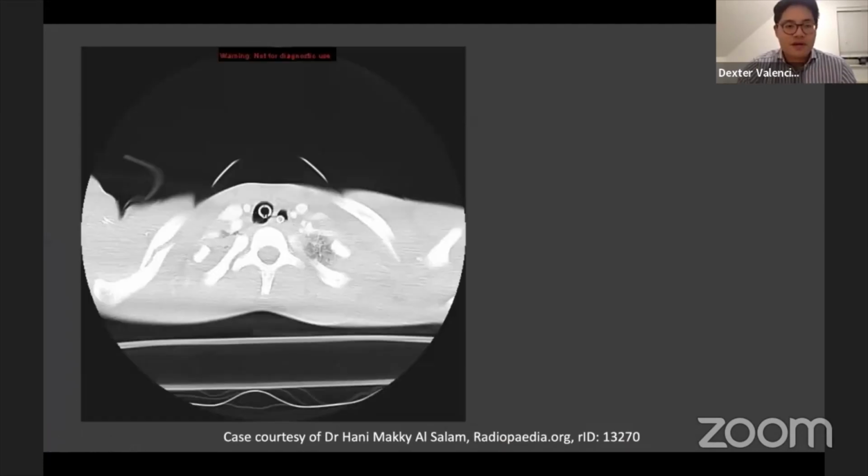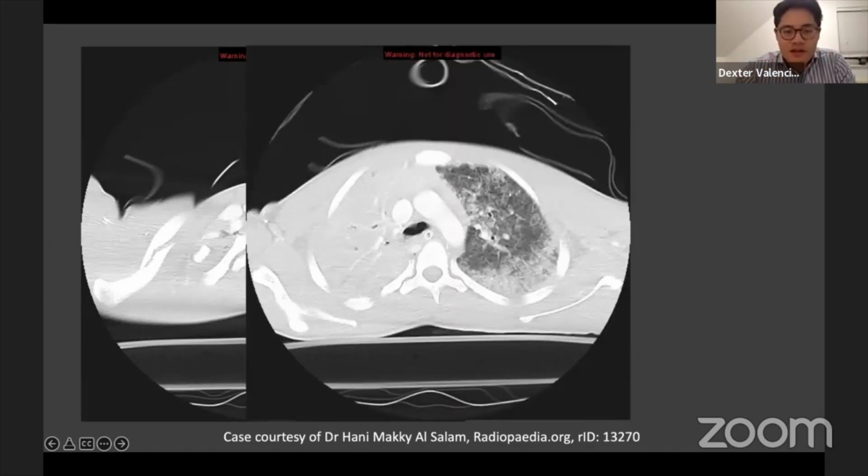So this is a patient who has come in as a trauma. We can see that there's an endotracheal tube. This is within the trachea. They've got an NG tube here. So they're quite unwell. They've been intubated. We can see this is the right clavicle, and you can see that there's a fracture here. So high impact. We're just going to go through some of the slides and put together some of the things you've learned today.